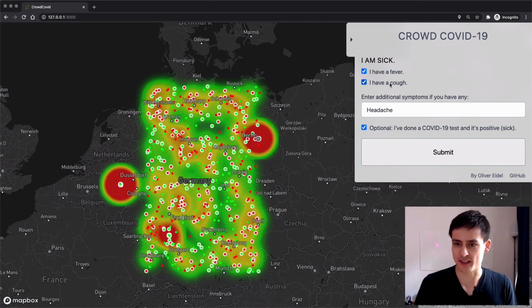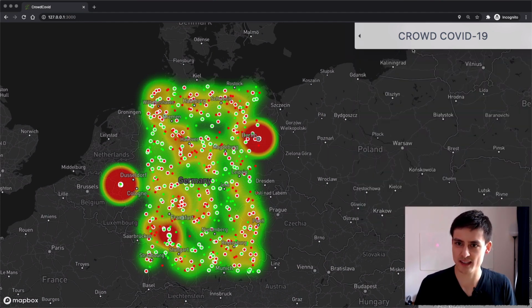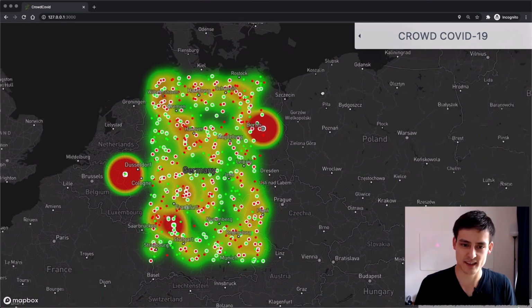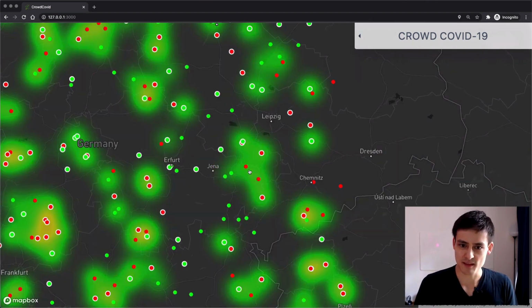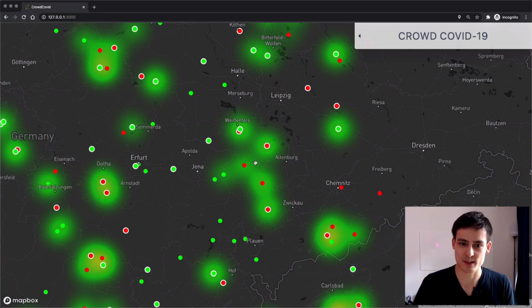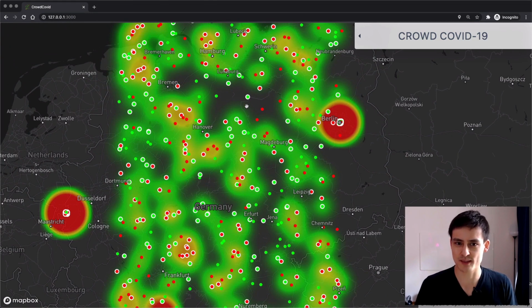And yeah, I've done a test. Let's just say I've got all the stuff here. So submit it. Okay, same screen in the end. That's pretty much it, and you're pretty much good to go. You can also hide it, but it's not a killer feature. So that's what the CrowdCovid application is all about. I hope you understood it mostly. The source is actually up on GitHub.